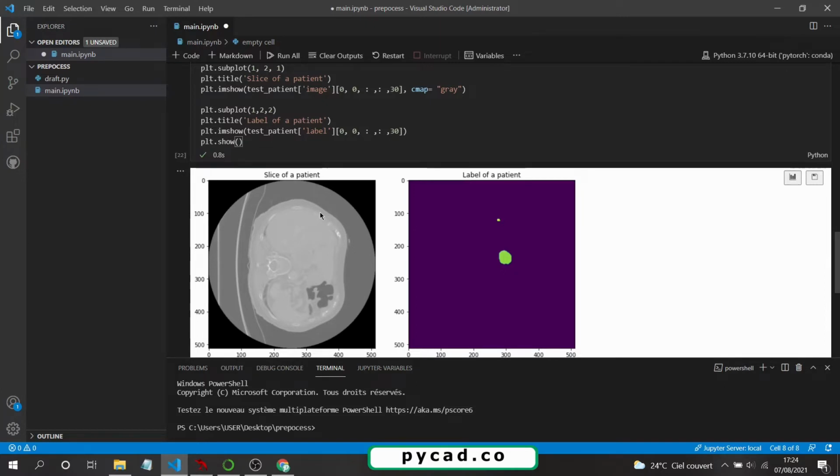But before doing this, there is something that I want to talk about. We know that in normal 2D images there are pixels, and here we have voxels, because we have 3D images with depth. Each pixel has width, height and depth. So when we have a depth, we talk about a voxel, which means a box, not a 2D square.